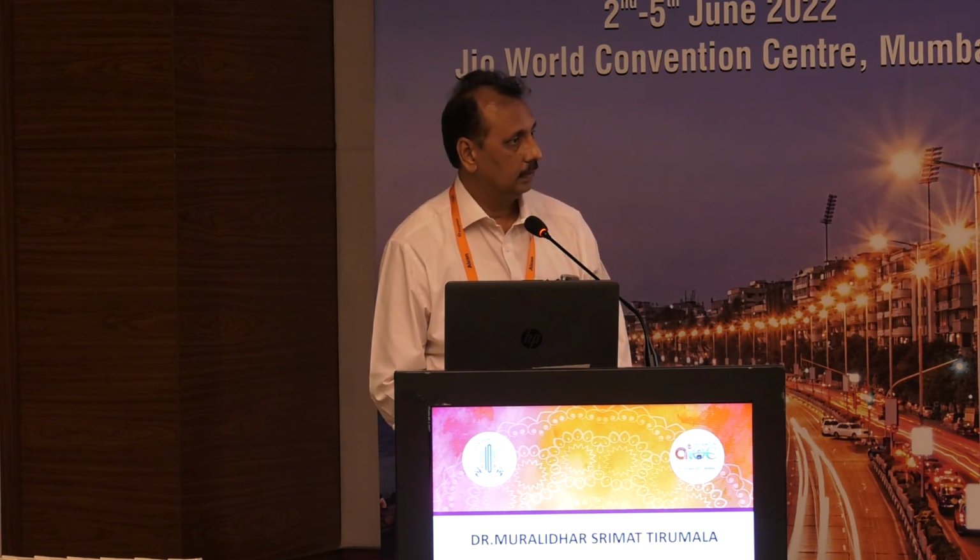Sometimes you might not pick up on the blue peak, and you end up looking at it on the near infrared, which can subtly tell you that there is some kind of melanin metabolism abnormality. The only drawback is if you have an ellipsoid disruption right under the fovea, then it's very difficult to pick it up even on the autofluorescence. Sometimes it gets drowned within that. That's all I wanted to say.